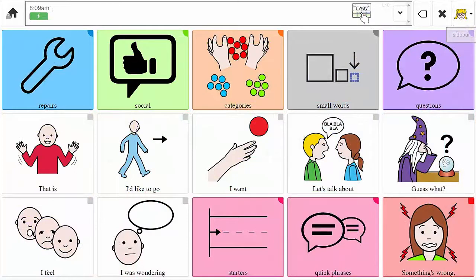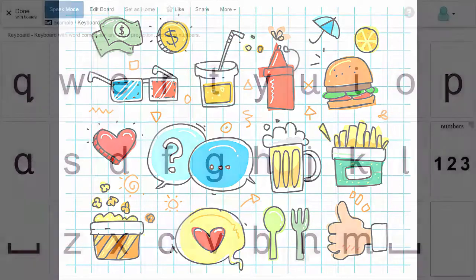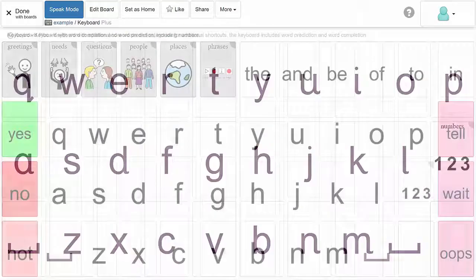CoughDrop also has a branching vocabulary set called Sequoia, which offers a communication set organized by pragmatic function. While it is unique in its options, this communication set is similar to categorical communication systems like Pod or Communicate. In addition to more robust communication sets, CoughDrop also offers a huge variety of fringe boards related to different topics or needs. There are a variety of keyboard-style boards.